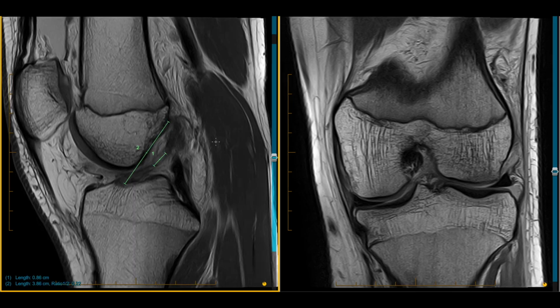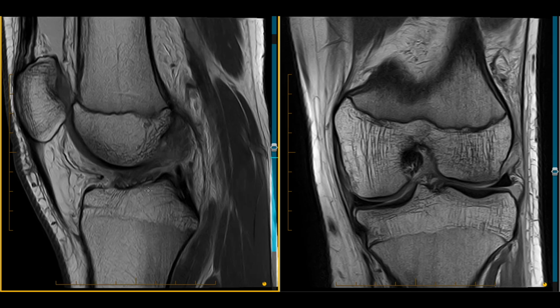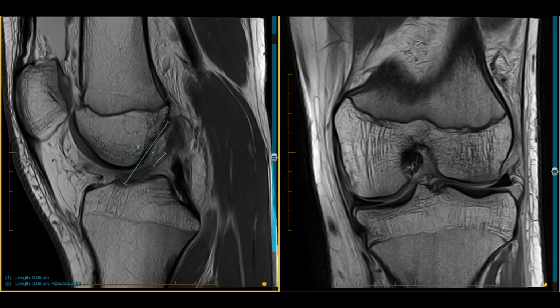So on the sagittal sequences now, you get the best representative sagittal sequence for the line of the ACL. Here are the tibial-sided fibres of the ACL, and these are the femoral-sided fibres of the ACL. You try and use the proton density as opposed to the proton density fat-sat images, and you look for the most distal end of the stump of the tibial side as well as the femoral side. And what we generally go by is the black to black.